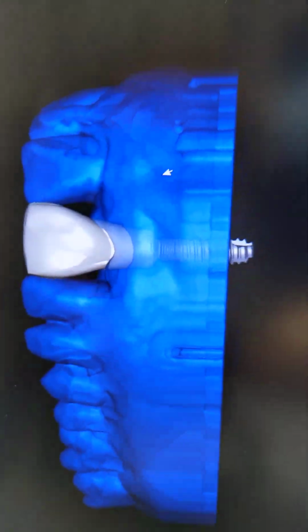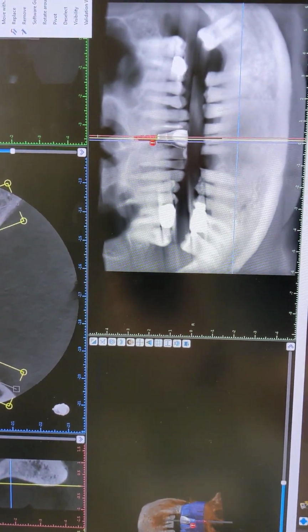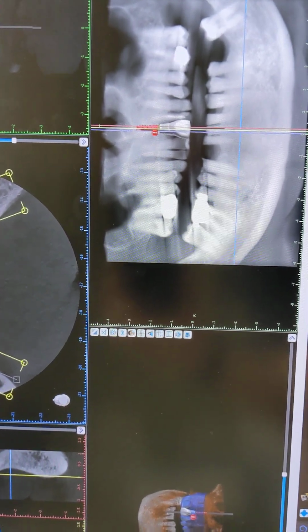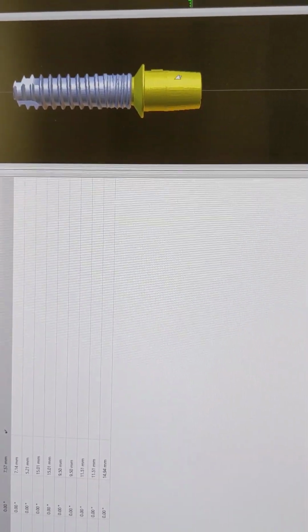Okay, so I put on this abutment, because if you go up here to implant list, I'll go back to advanced implant list, right click, replace abutment. You can see all the abutments here that are non-custom abutments that they have in there. So I picked this one. A lot of them are scan bodies. Anyway, it doesn't really matter, but that's the one I picked.